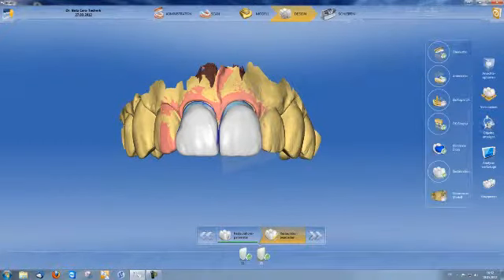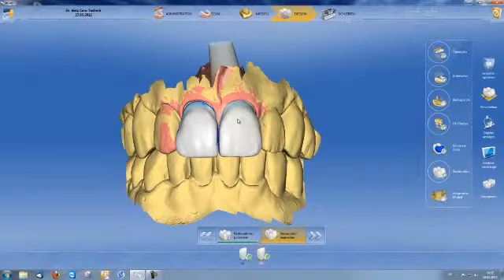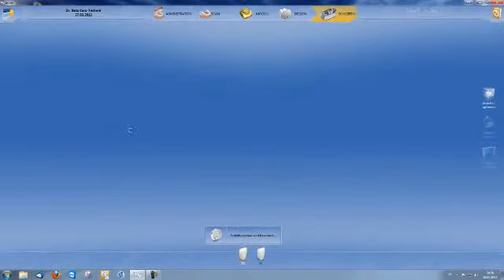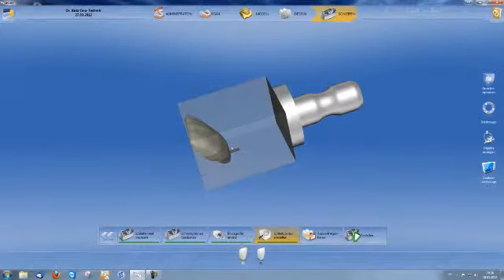I go to Display, Lower Jaw, and, as stated, I again have the option of extending or reducing the length of the veneers, and then I click on Mill. I can now position the restoration in the polychromatic block.